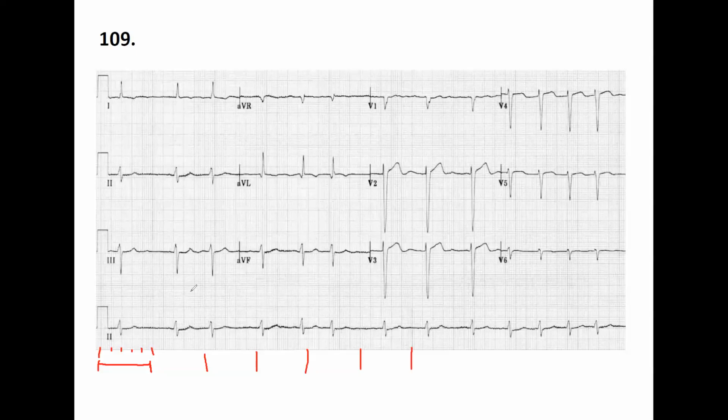And I'm assuming it's regular sinus rhythm. No. We haven't studied the arrhythmias yet, but the normal sinus rhythm considers that the rate should be between 60 and 100 plus. You should see a P wave preceding the QRS complex all the time, and it should be rhythmic. The PR should be equal, but this is not, because we do have irregularity. This is not a normal sinus rhythm. And another thing, there is no P wave.